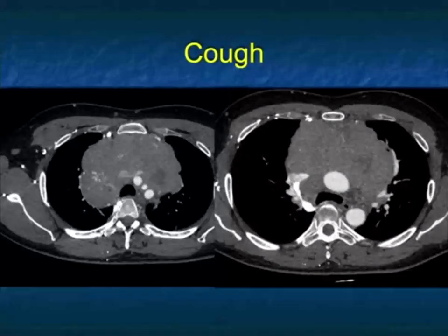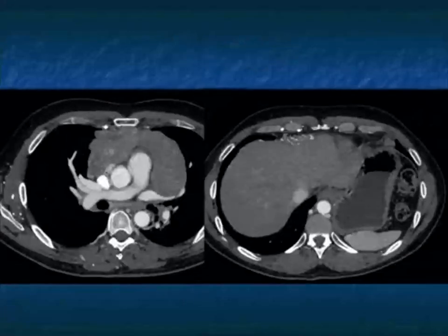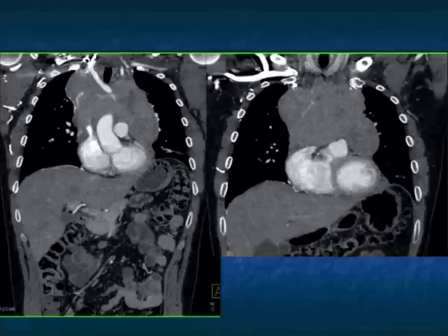Another patient, large anterior mediastinal mass. Again, lymphoma is a possibility, teratoma is a possibility. A huge thymoma would be a consideration. It's not substernal thyroid. It does involve the SVC, so it's an aggressive lesion. You can see some of the collaterals. You can see how low the lesion extends. You can see how bulky it is.